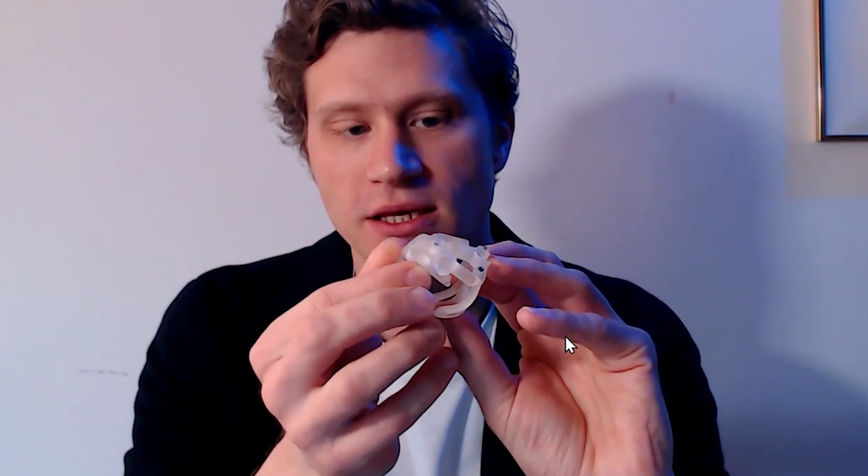Now I will demonstrate how to create a stackable surgical guide in coDiagnostiX, using this case as an example. We will use a bone reduction guide and a positioner guide. The positioner guide is connected with the bone reduction guide and fixed on the teeth.